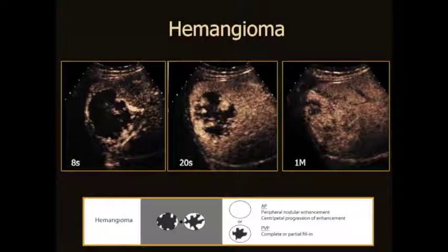So here's a patient, a young person who came in with a massive pulmonary embolism. On the CT scan performed for the pulmonary embolism, a large mass was incidentally noted in the liver. The clinicians instantly thought this patient might have malignancy with clotting problems, and so asked us if we could confirm the nature of this mass.